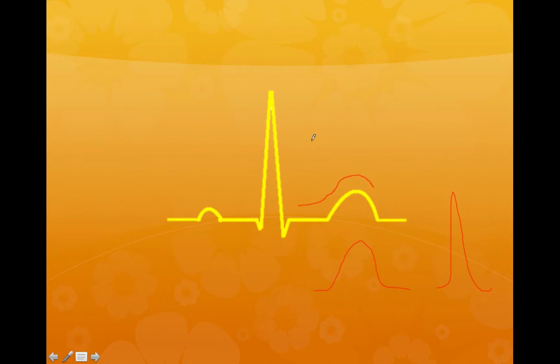But sometimes the first manifestation of an acute occlusion is the gradual T wave upstroke flattening. I'd say that's probably the best word for it. T wave upstroke flattening here, and then slowly that can progress to a bit of tombstoning, a bit of ST elevation. But what we need to remember is it should be asymmetric and it should be small with respect to the QRS wave.